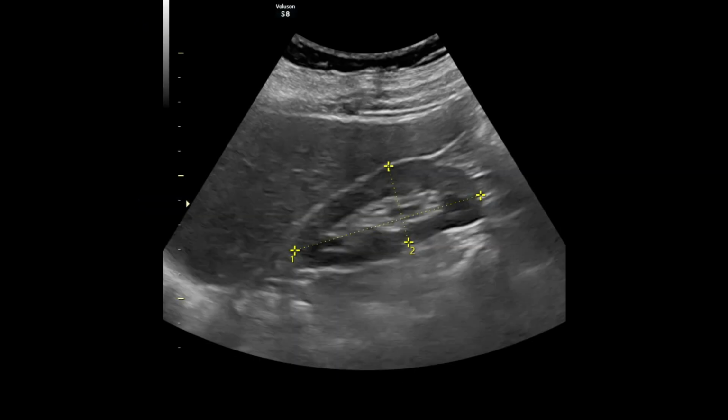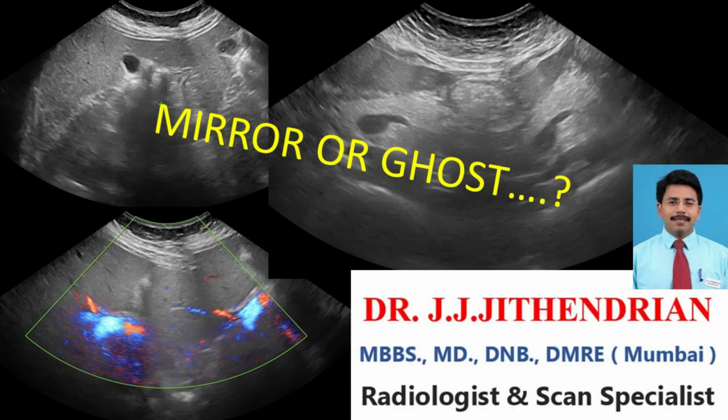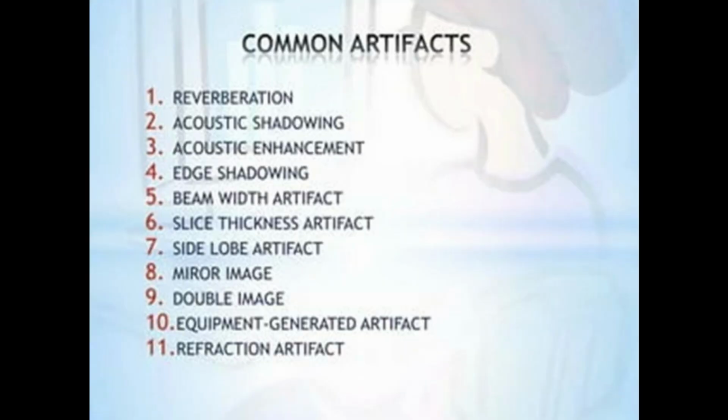What was that? I inquired with the application specialist how that could happen, and he verified with the senior director and conveyed that such a thing had happened 3 times in our city, in the same type of machines with the same probe. Finally, I'll tell you how it got resolved in a few seconds.